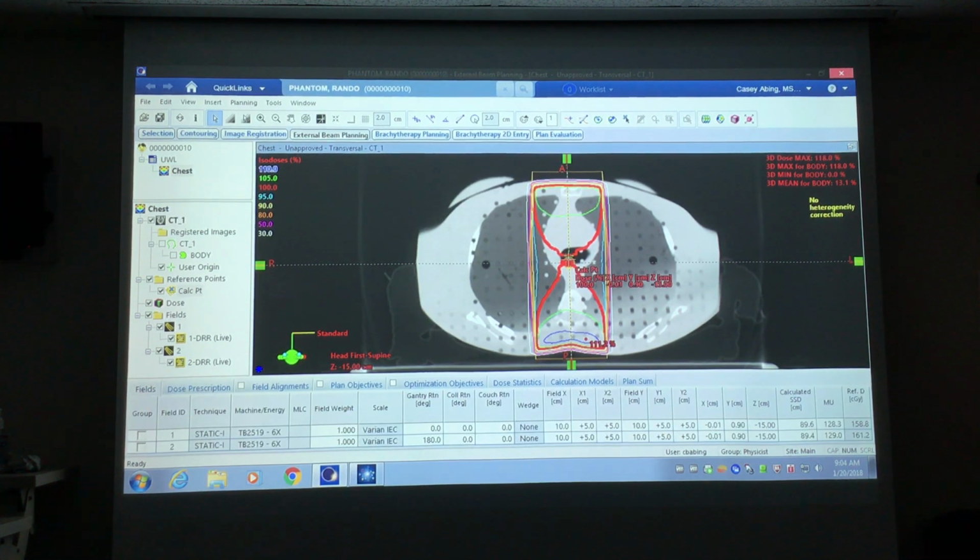In this case, for the therapists, they can just set this isocenter point midline, mid-plane in the patient, and then they can rotate the gantry around 0 to 180. They don't have to move the patient at all. So an SAD setup is much more efficient at treating the patient.